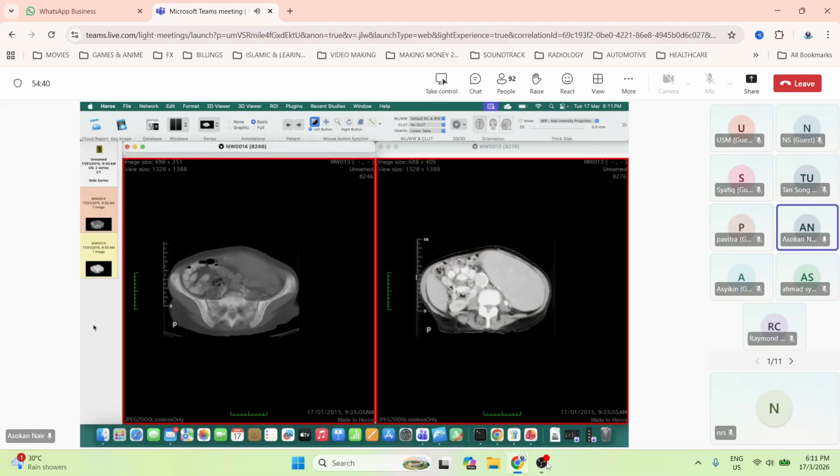Okay, next. I'll give it a try. So I'm presented with the CT scan in axial sections at the level of the pelvic brim. From the plain scan, I can see that there is an irregular mass occupying the left side of the abdomen with ill-defined margins.